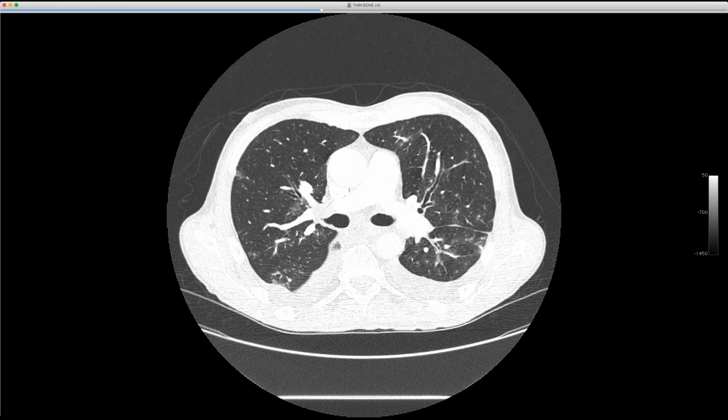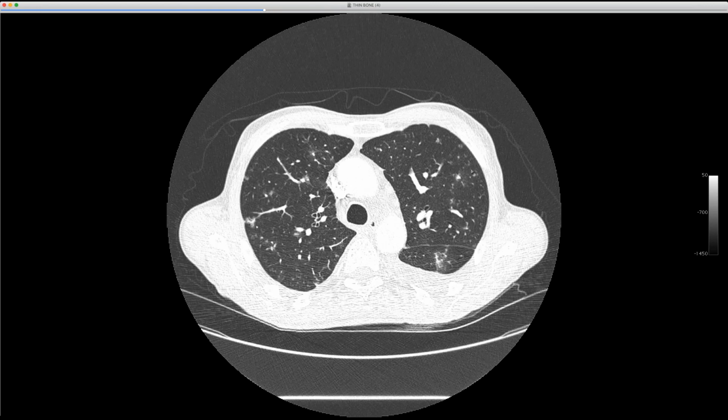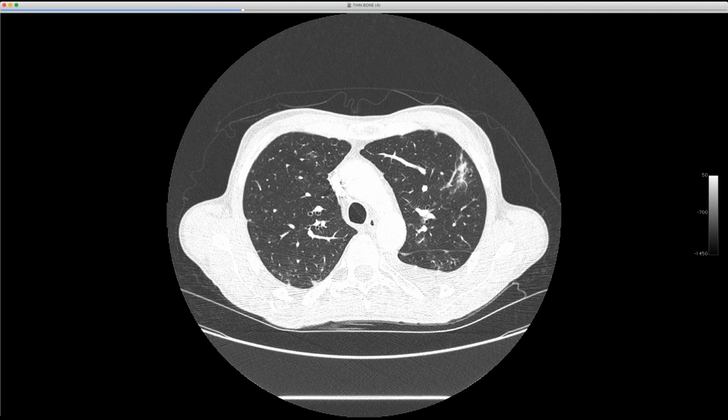This is more normal. You see a few for about a couple millimeters of the side branch, but this guy up here, where did he go? You see all these little tiny side branches going all the way to the pleural surface. So I don't know, what do you guys think of that? Or my theory? That it's vascular and maybe venous, huh?